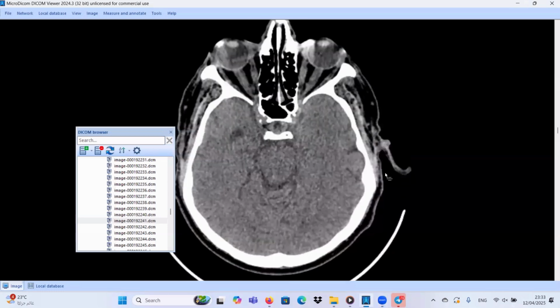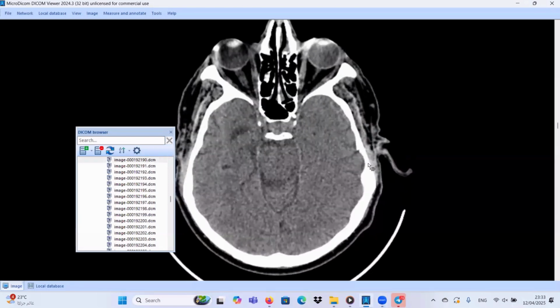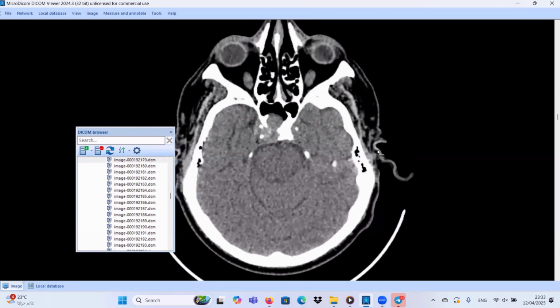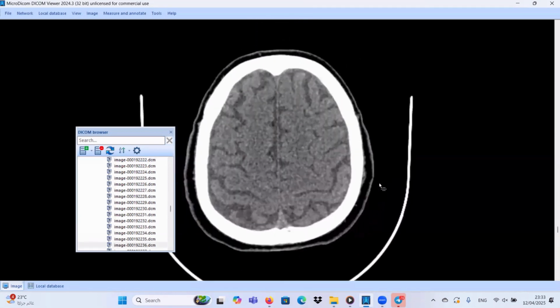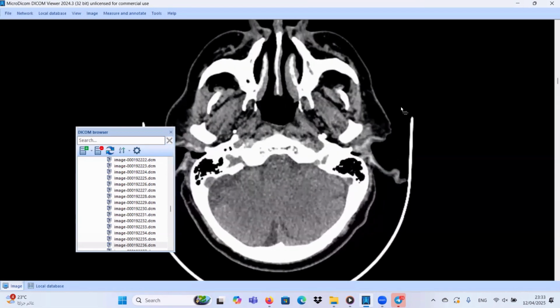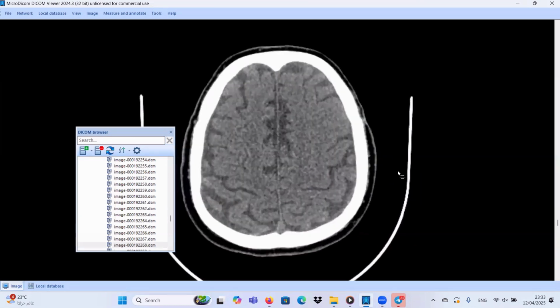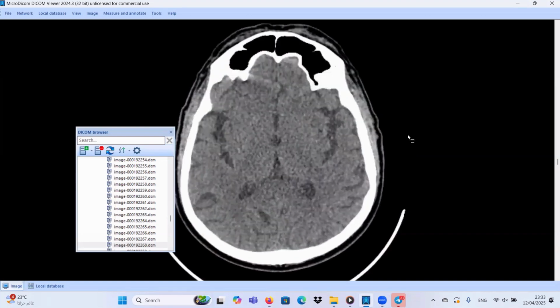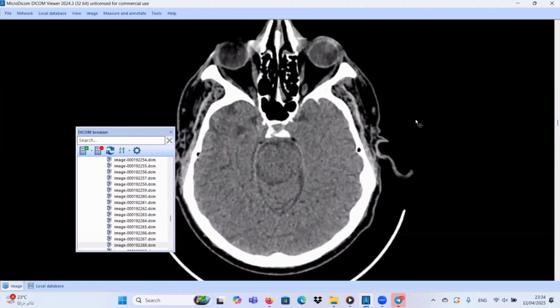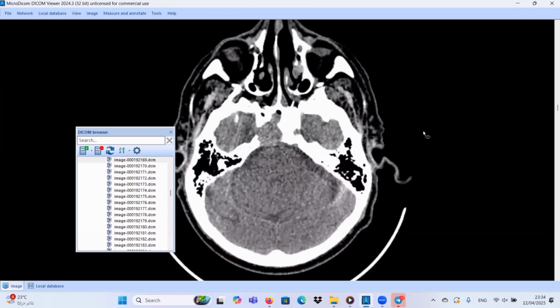This case is a non-contrast scan of the brain for an adult patient. Really, I don't have enough history for the patient. But apparently, we don't have any areas of high blood density, no brain edema, no specific lesions. Let's apply our CT brain checklist. We don't have any extrinsic collections. Gray-white matter interface is preserved. Go point by point through your checklist, and you will find something abnormal here at the skull base. Something like a posterior lesion.